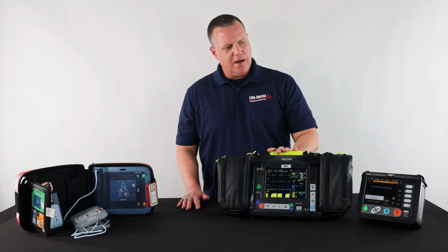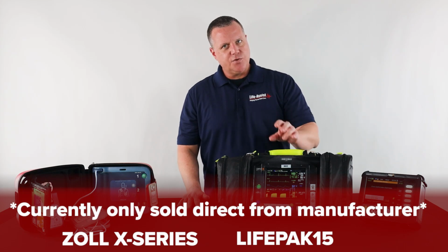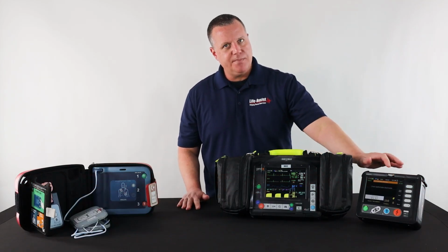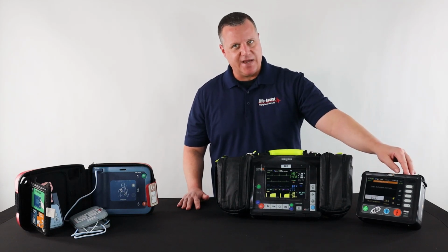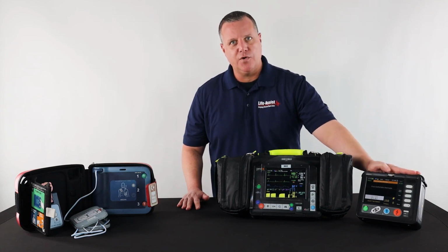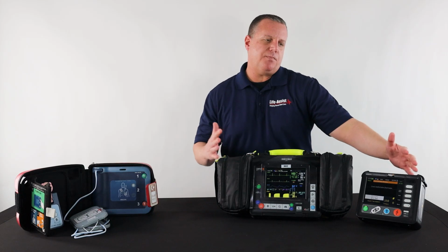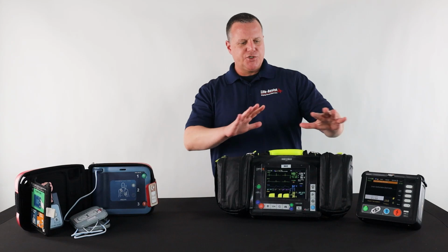Wanted to note one thing, the Tempus is still fairly new. The Physio LifePak and the Zolls are one-piece units, and the Tempus is a two-piece unit. So keep that in mind. What they did is they took the therapy portion that does all the cardiac interventions and they put it as a separate device. So this part right here is going to be doing the shocking, the pacing, and the cardioverting. But via Bluetooth, it is connected. So it's going to input and give you all the data you need. So they're separate but together in a lot of ways. Okay, so that's pretty much the cardiac monitor.